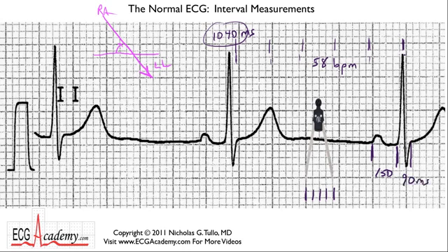Now, let's look at another QRS complex, just to double check. Because, after all, there are a couple here. Now, you can see the QRS ends just before the heavy line, and it starts just before this light line. And so you have 2 boxes almost exactly. And here as well. I mean, I think perhaps on second thought, this is probably more like 80 or 85 milliseconds.